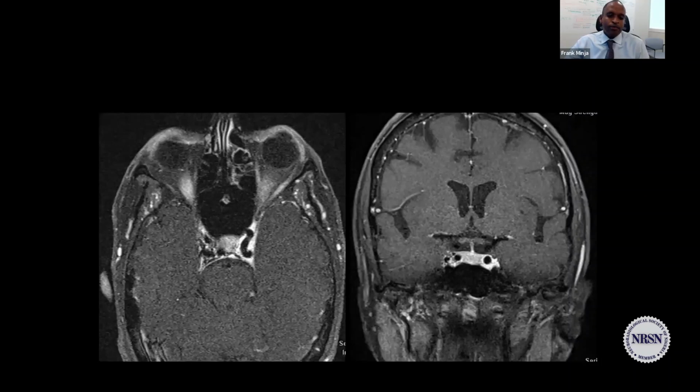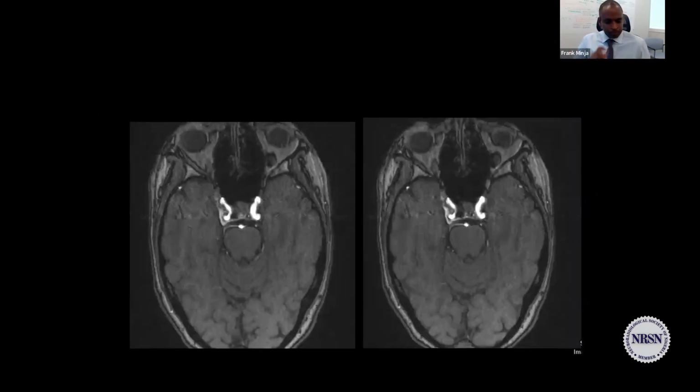It was a dural AV fistula on the left, right? And again, just to point out, this is a time of flight MRI angiogram. What it's showing you, you should not see venous flow, right? You should not see venous structures on a time of flight MRI angiogram. So anytime you see arterialized flow within the cavernous sinus, that is an indication of a shunting lesion. And in this case, this was a dural AV fistula.